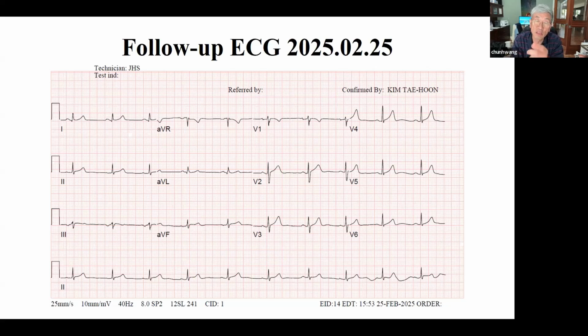What we learn in this type of patient, when you have narrow complex tachycardia, AVNRT is the most common. Second is obviously ectopic atrial tachycardia, but ectopic atrial tachycardia often comes from the junction between the left atrial posterolateral wall, posteroseptal wall, and the roof of a persistent left superior vena cava. So where did you ablate this patient? Do you know the ablation site?